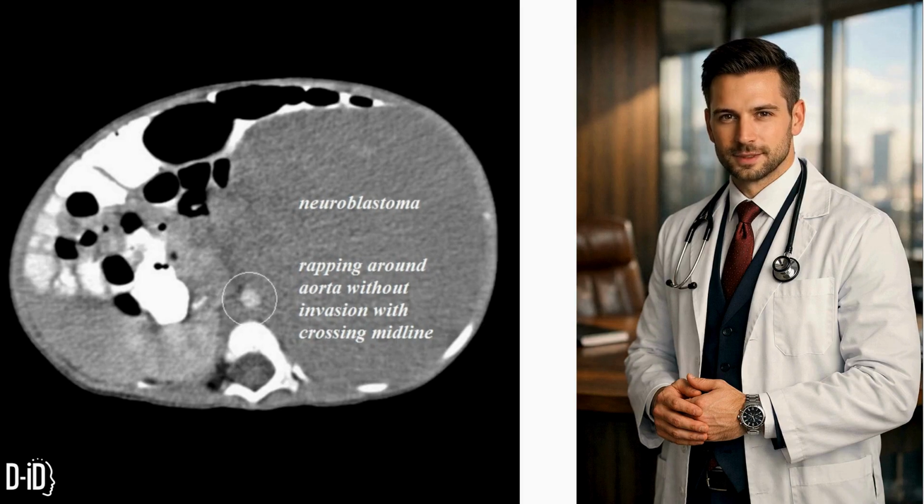Wilms tumor is an expansive grower. It acts like a giant balloon. It pushes the vessels, the liver, and the bowel out of its way. If you see the aorta pushed to the opposite side but not surrounded, that points toward Wilms.